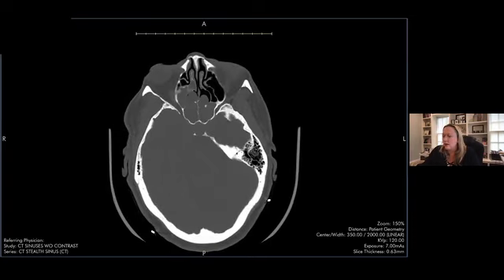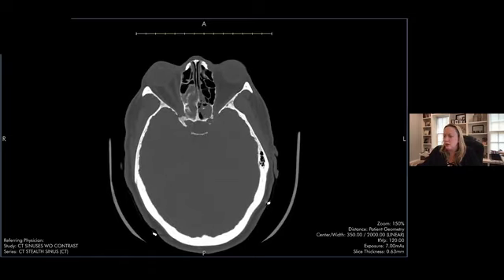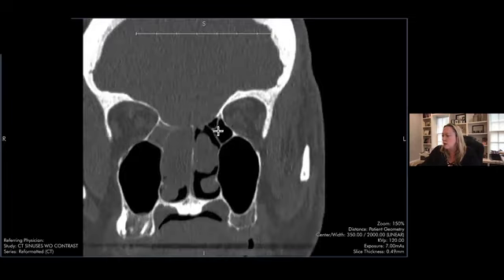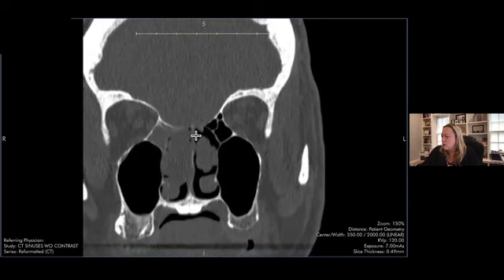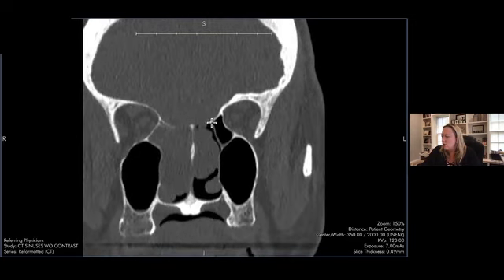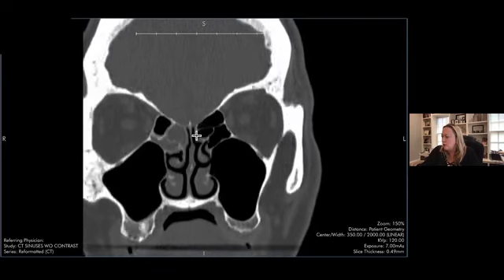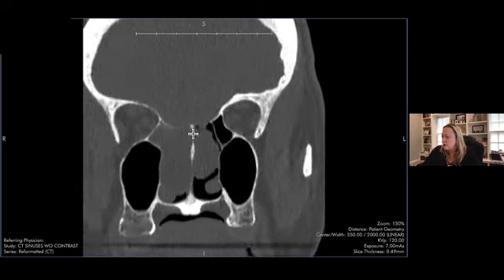In every sinus CT, especially if stuff comes all the way to the skull base, you definitely want to look in your coronal plane and your sagittal plane to look at the integrity of the skull base. And here on the coronals, you can actually see that there's dehiscence of the adjacent skull base, kind of bilaterally, involving that posterior ethmoid roof and sort of anterior planum sphenoidale.